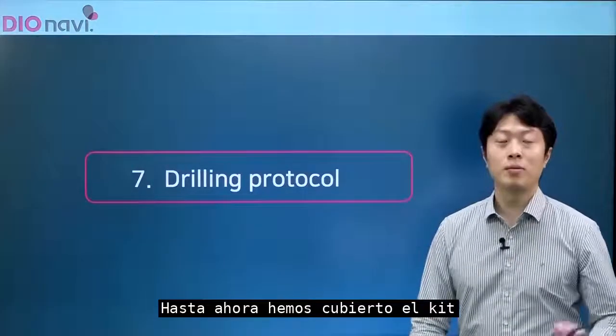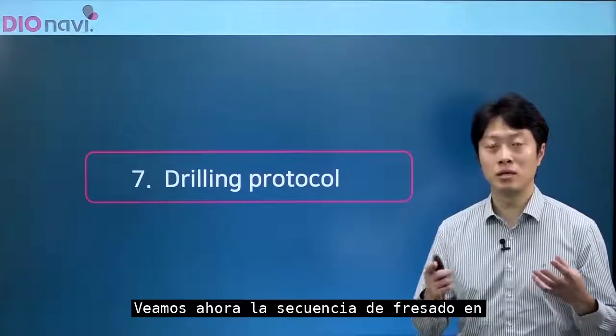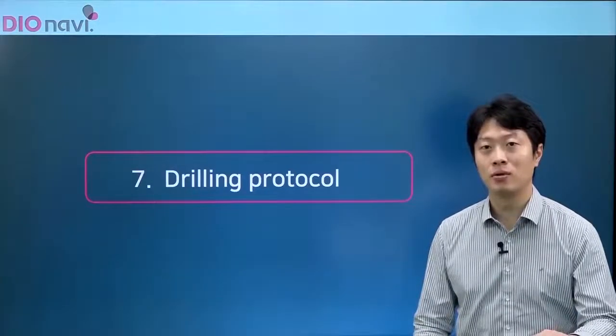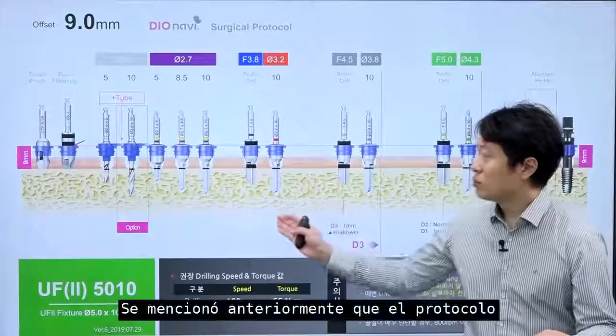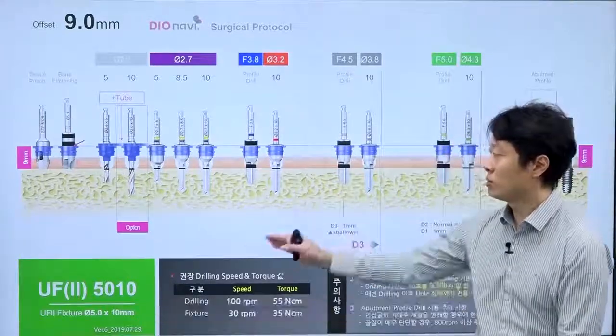We've so far covered the surgical kit. Let's now find out the drilling sequence in general with the surgical kit. I mentioned earlier that the surgical protocol is delivered to the dentists.